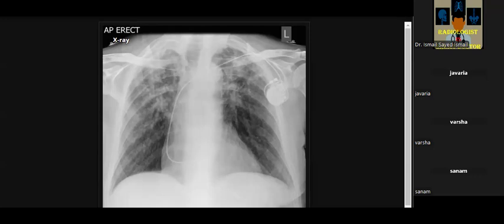Right. Okay, my friends, revise the cardiac pacemaker. We have a single lead, we have a dual lead, we have a biventricular. When I say biventricular, it is not in both ventricles; it is in the right atrium, right ventricle, and in the coronary sinus. As you said, my friend, very good.